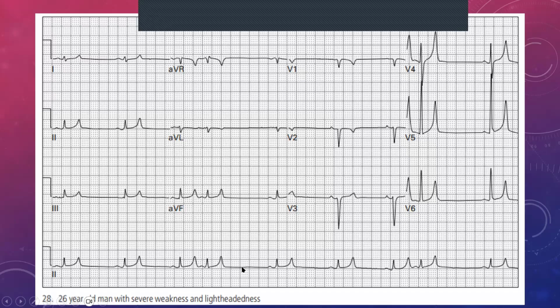Technically, I don't want to get into the technicalities of this, but in actual fact, this is the abnormal beat, the one that you're seeing here, not this one here. But that's a bit technical, and I don't want to stress you out about it. What you've got is a regular, irregular beat. If you're feeling the pulse, you'd feel pulse, pulse, pulse, pulse, and that's how it would continue on. So you'd have regular, irregular beats. And the rate would be determined by the QRS complexes that are the furthest from one another. So these are quite far.